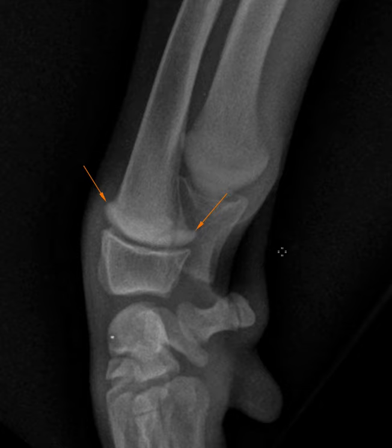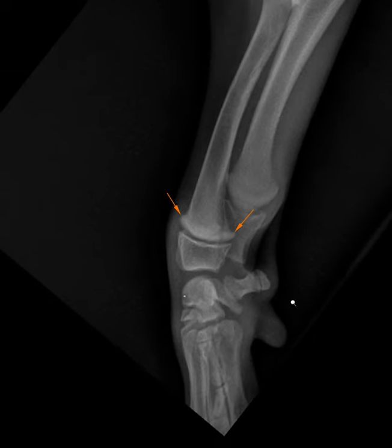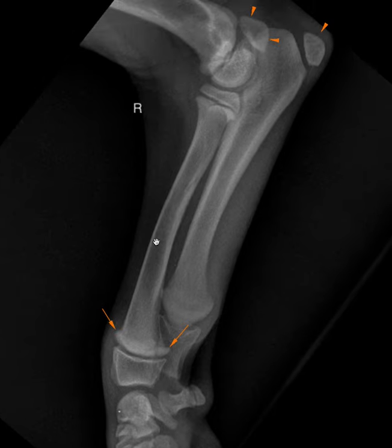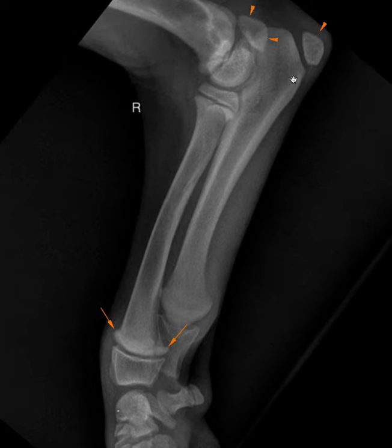But I wanted to show you this case just to give you an example of how, when we're looking through these radiographs of puppies, we really have to wade through a lot of different things and orient ourselves with all these physes. I forgot to show you one of my favorites. Look at how cute the little physis at the accessory carpal bone is. So it's unclear whether this puppy has pain that's localized or not.